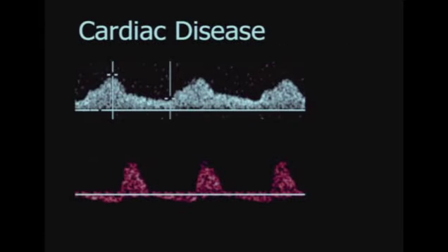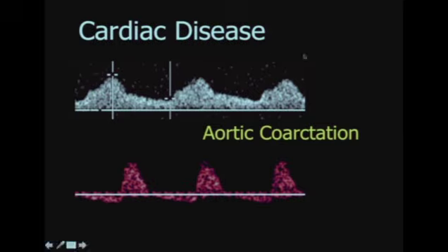Similarly, these are some abnormal waveforms. In the top one, you have delayed systolic upstroke, a very abnormal looking waveform, and this was in a young child with aortic coarctation and sort of a tardus parvus waveform within the common abdominal aorta. And in this last one, you see this abnormal reversal of flow in diastole, and that's someone with a patent ductus arteriosus that, because of the rapid runoff into the low pressure pulmonary circulation, is not able to maintain positive diastolic pressures.